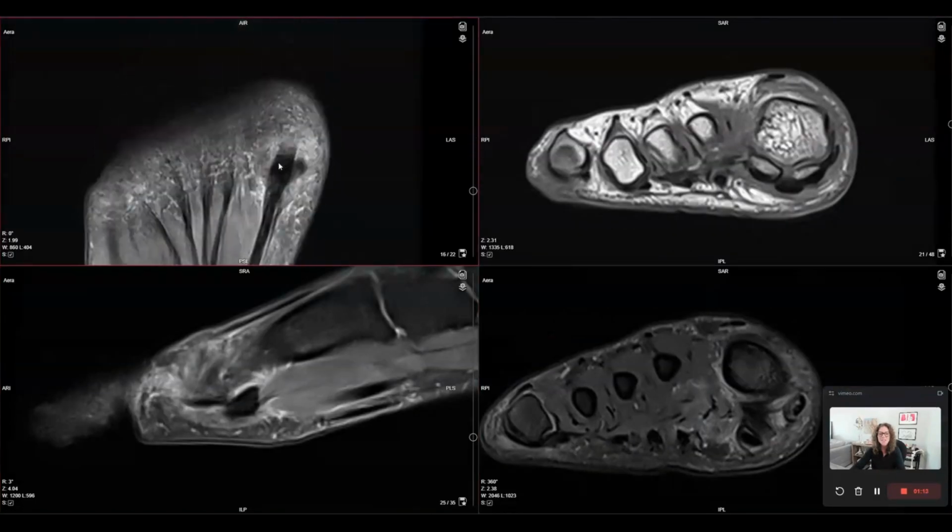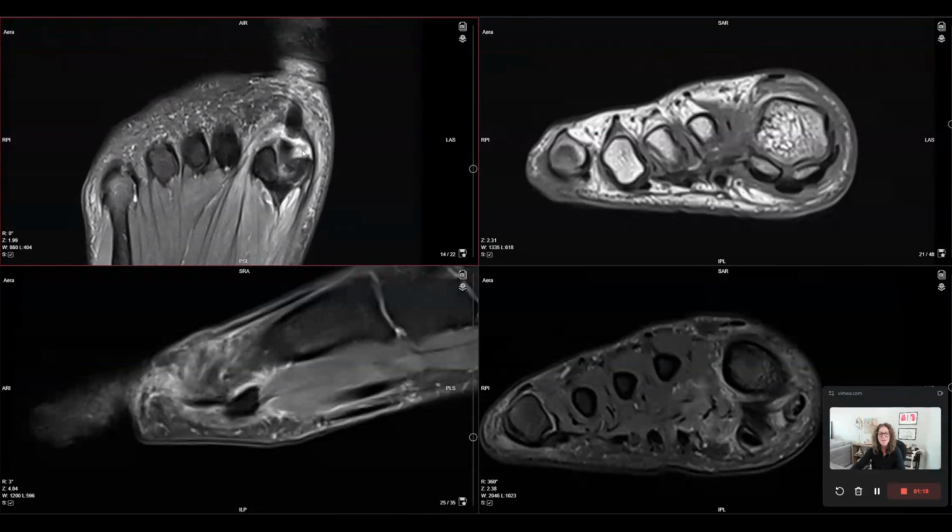When we look at sesamoids, we want the sesamoids to be on about the same line. When we see that there's retraction of one or another, we want to give that a measurement, as we can basically tell that if something's greater than 3 millimeters in distance of gap, that may indicate that there's actually a plantar plate rupture. So if you see that on x-ray, go ahead and recommend that MRI, as the patient might have a plantar plate tear.